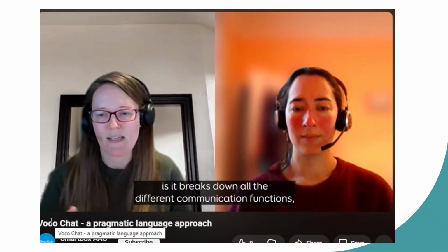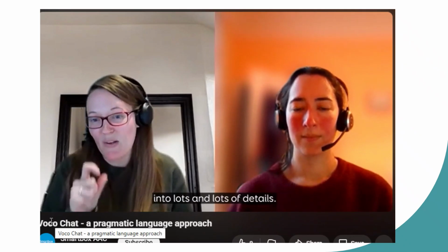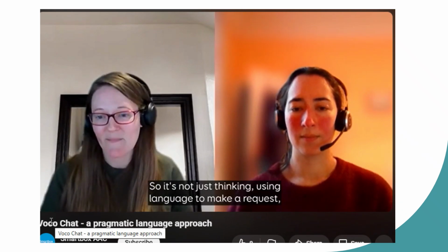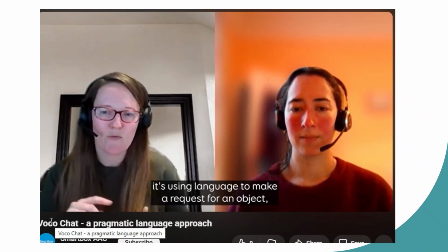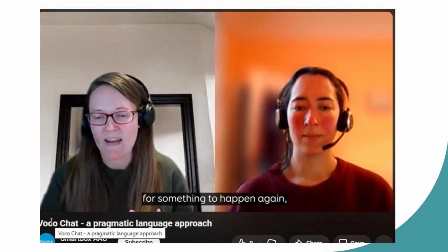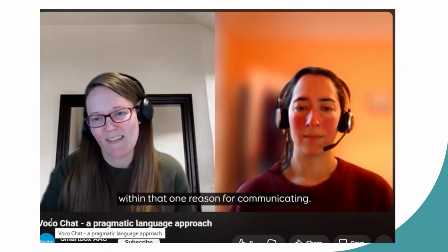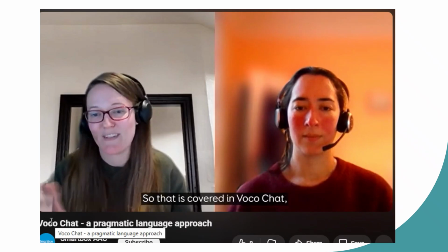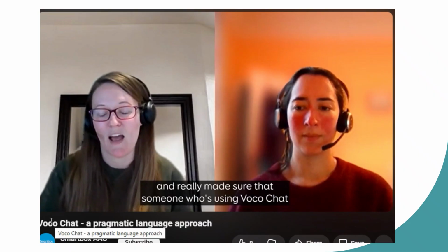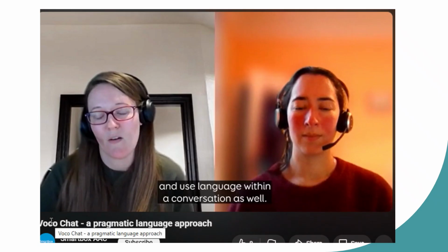But what it does is it breaks down all the different communication functions, the reasons that we communicate, into lots and lots of detail. So it's not just using language to make a request, it's using language to make a request for an object, for an activity, for a person, for something to happen again, and lots of different reasons within that one reason for communicating. So that is covered in VocoChat. We've gone through that resource and really made sure that someone who's using VocoChat can communicate for a really wide range of reasons and use language within a conversation as well.